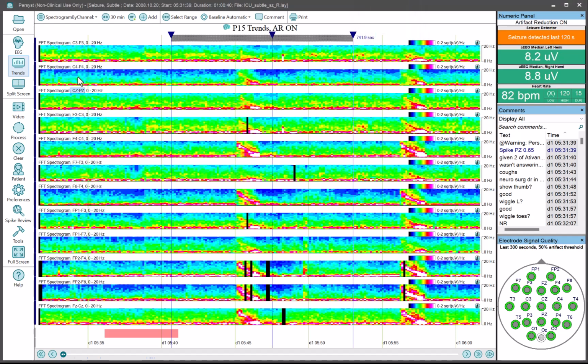I would get bipolar channels. These values, export that as a CSV, and I would have, since this goes to 20 hertz, there would be 40 columns for C3 to P3, 40 columns for C4 to P4, and so on, for the length of the range. That was done every 8 seconds. Easy to do.